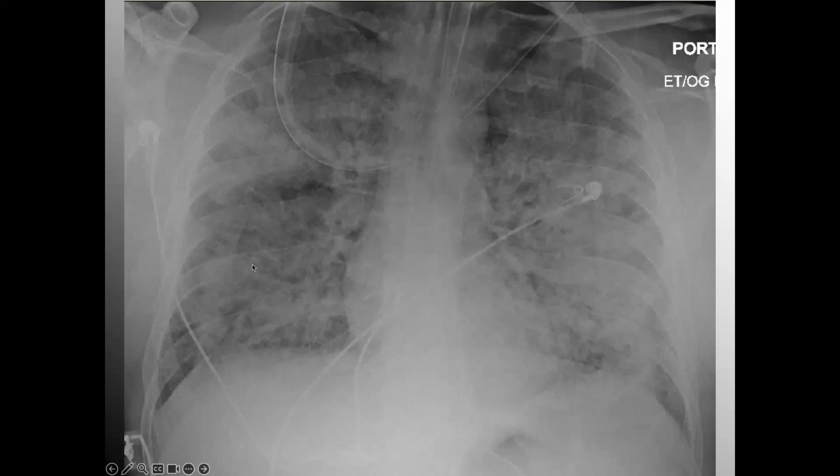So this technically is probably ARDS, acute respiratory distress syndrome, but could also be similar to COVID-19. Oh my God, we said the C word, my apologies. COVID-19, it could be, or any type of severe pulmonary edema. It's also known as an alveolar pattern, or what is considered non-vascular haziness.